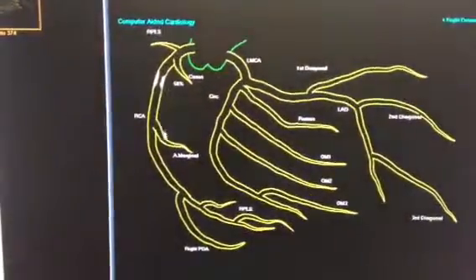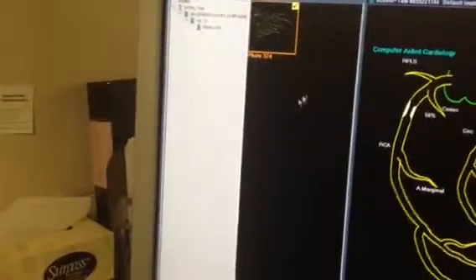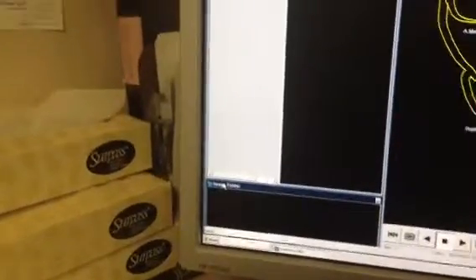And this is where he would select the pictures that he did, put them into the image folder, and send it on. The tree is only here because I had already been in this application and made a tree and had already pushed it over to Accelera. But what you'll see are pictures that were made by the Accelera. He will drag that picture, drop it down here, right-click, send to CIS, just like he normally would.